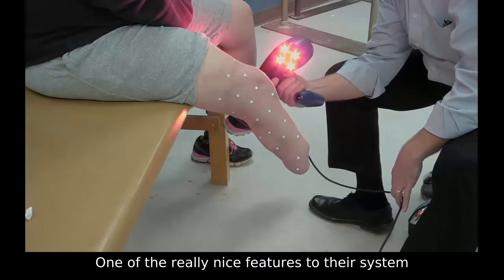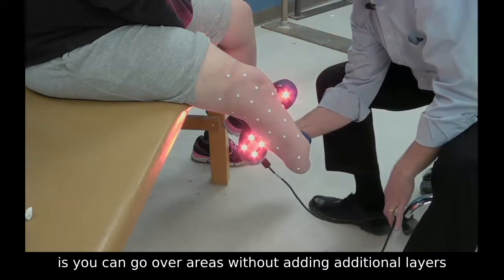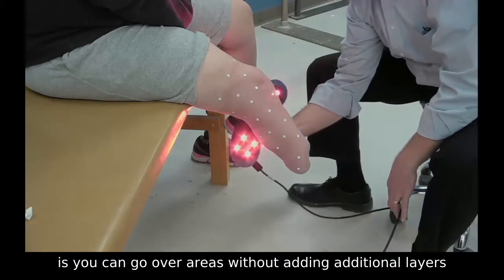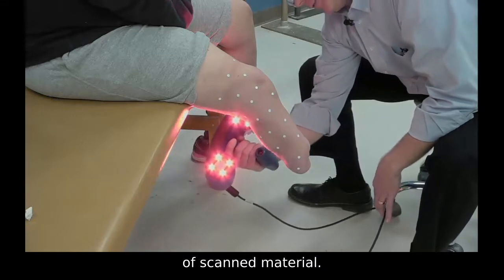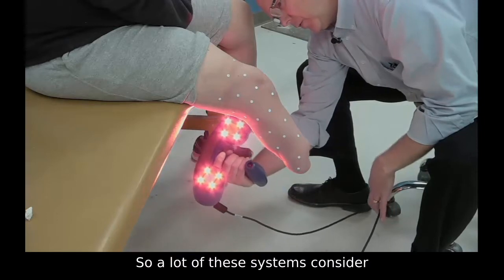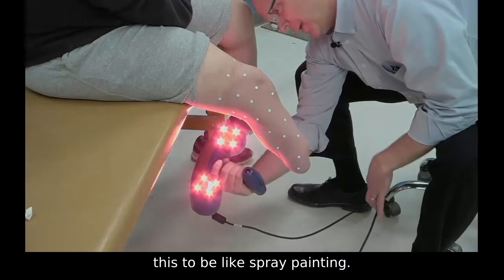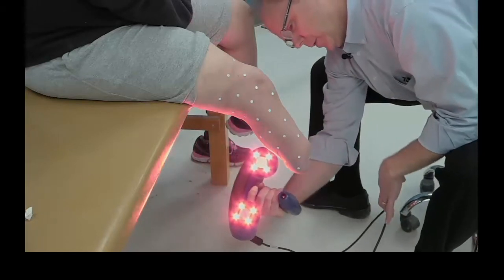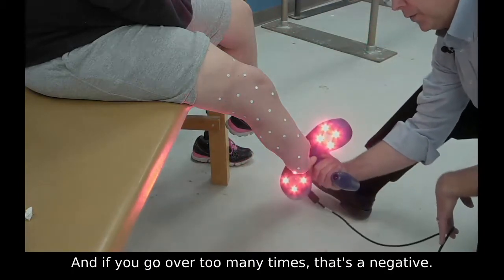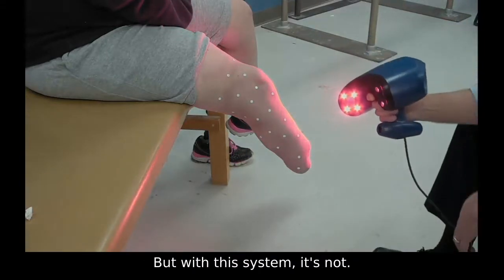So one of the really nice features to their system is you can go over areas without adding additional layers of scanned material. A lot of these systems consider this to be like spray painting, and if you go over too many times, that's a negative, but with this system, it's not.